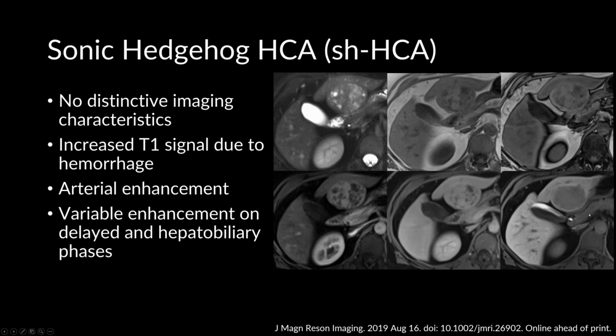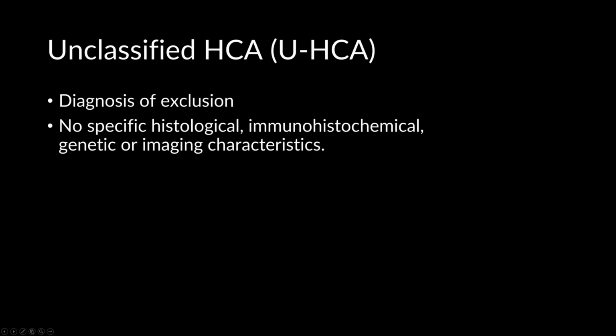This was deemed to be a sonic hedgehog lesion with internal blood products, which are not terribly obvious to me on the imaging, but that's what the pathologist reported back. And finally, we have the unclassified subtype, where this is basically a diagnosis of exclusion. There's no specific pathological way of subtyping it. There's no imaging characteristics or anything like that.